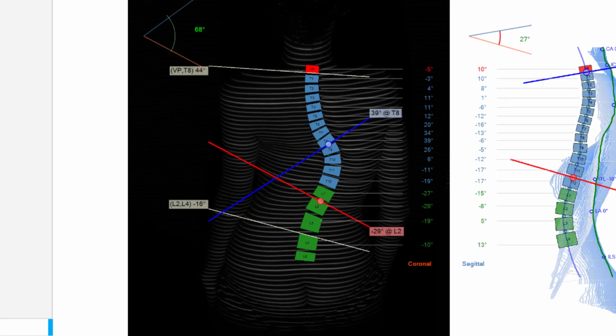In the course of a scoliotic profile, segments perform lateral flexion. The segments of the spinal model that are most inclined to the side in opposite directions are detected in the first step. The second step then calculates the opening angle formed by the two lateral inclination angles with respect to each other. So the basic calculation is identical to the calculation according to Cobb. So where is the difference?